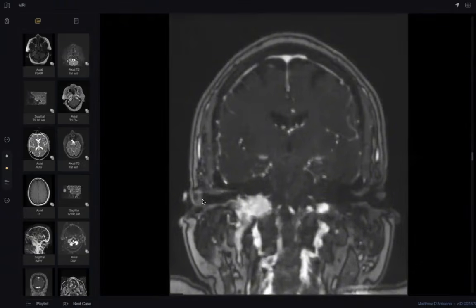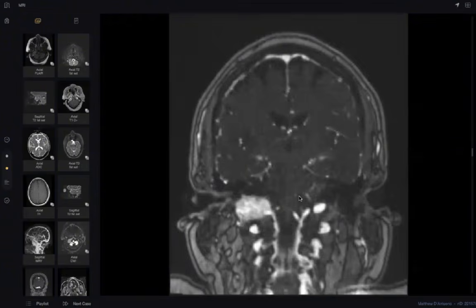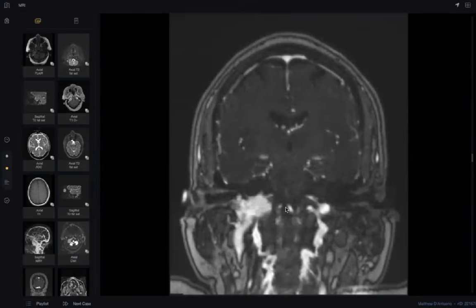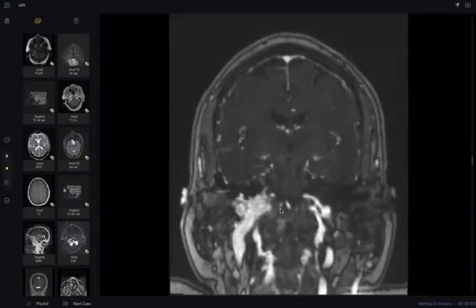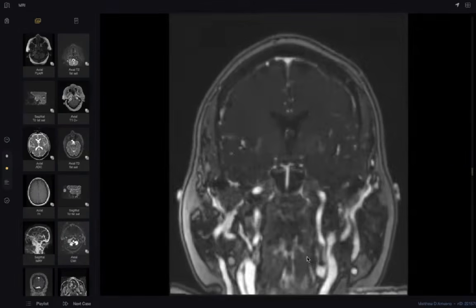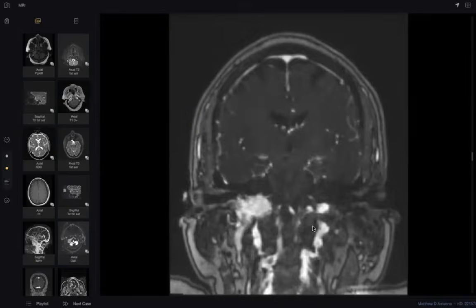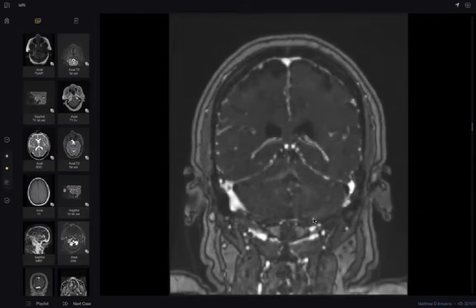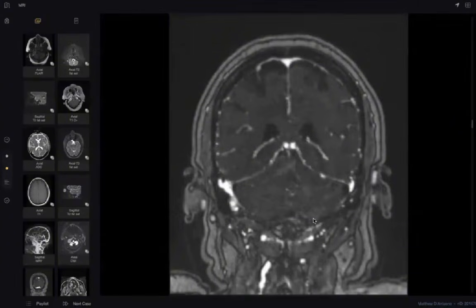So I will immediately convey my finding to the referring physician and refer this patient to ENT for further management. Also, in my routine practice, I will look for other paragangliomas in the body to rule out any syndromic association in these patients. What's the other differential diagnosis? You mentioned this is what type of paraganglioma? Jugular paraganglioma, as I could not find extension to the middle ear cavity.